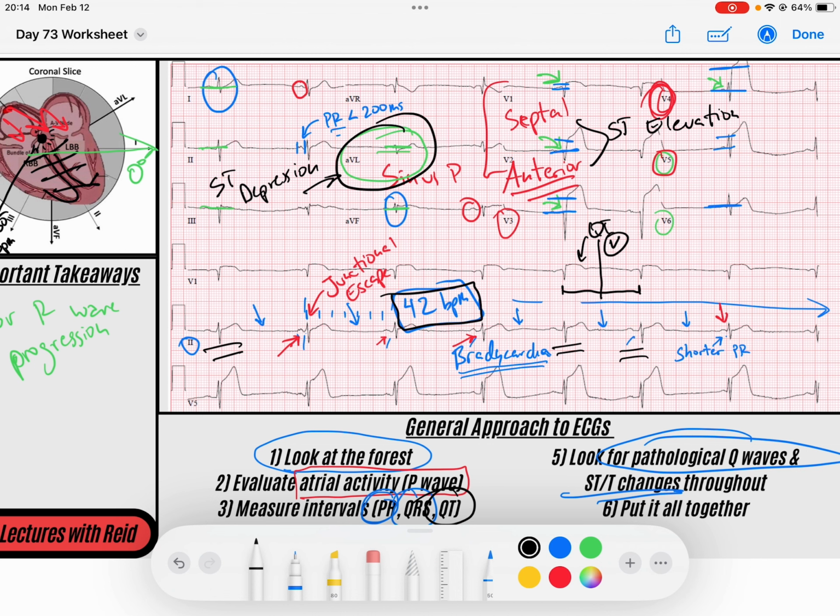And so that's really significant for myocardial infarction in the right clinical setting, really in any clinical setting. And you can already see we've got these pathological Q waves that are developing in these leads, telling me that we need to probably intervene on this pretty soon because there's already some myocardium that has completed the infarction. Probably the most deep endocardium has already completed the infarction.